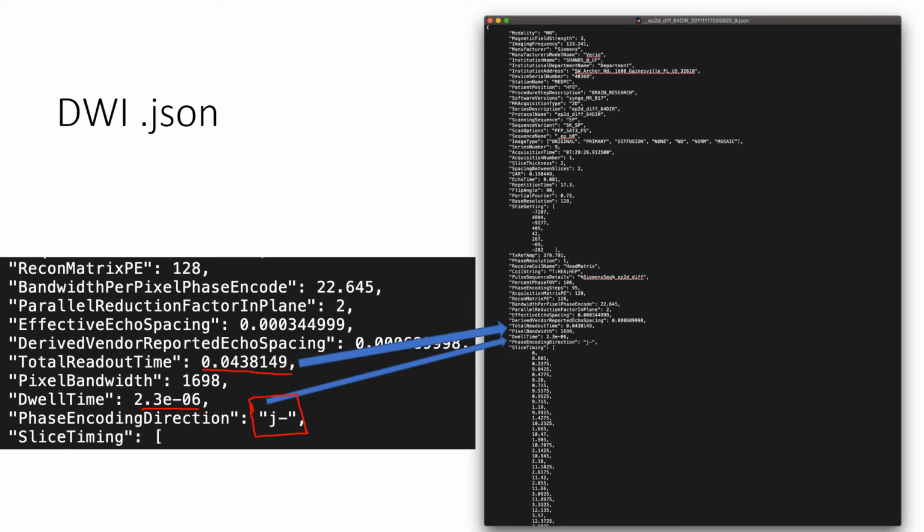That was just warping that happened because of the sinuses. So a lot of the warping with this J minus phase encoding, also called an AP, anterior to posterior, ends up in the front. And if this was a J plus, then it would be a PA, a posterior to anterior phase encoding, with most of the warping in the back of the brain.